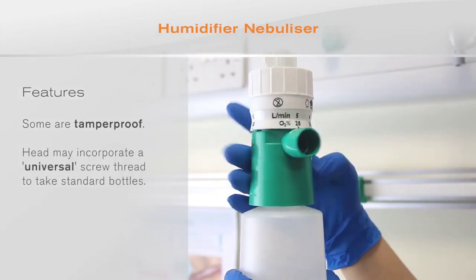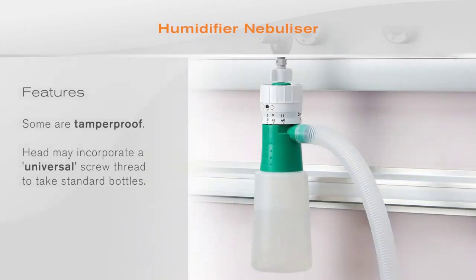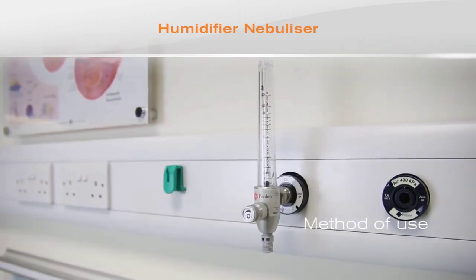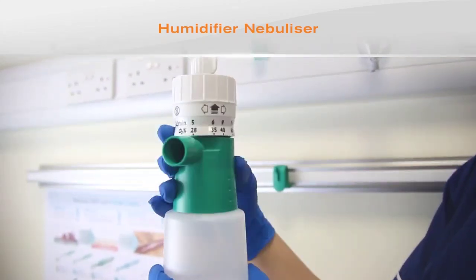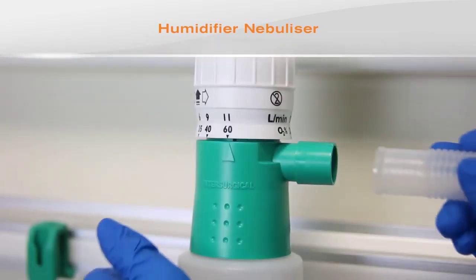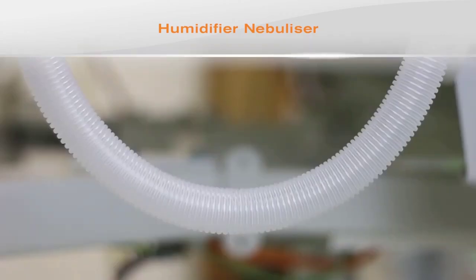The head of the Aquamist nebulizer humidifier incorporates a universal screw thread. This permits the use of a bottle which can be refilled with sterile water, or the use of some pre-filled sterile water bottles. The flow meter should be attached to an appropriate oxygen supply. Fill the bottle with sterile water using an aseptic technique and fit to the humidifier head. The humidifier nebulizer should then be attached to the flow meter. Attach 22mm flex tube to the outlet of the humidifier nebulizer.